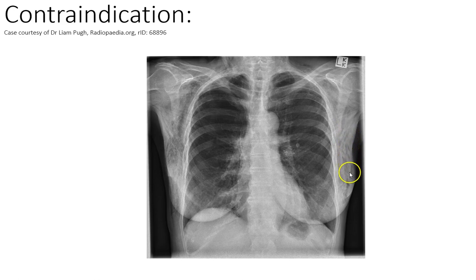You can see all the air in here. You can see all the air up into the neck and the scalenes and stuff. And somebody can be just full of surgical emphysema. It can be quite painful, not always, but it can be really, really painful depending on how tense it is. It can fill right up into somebody's eyes and really be very deforming.